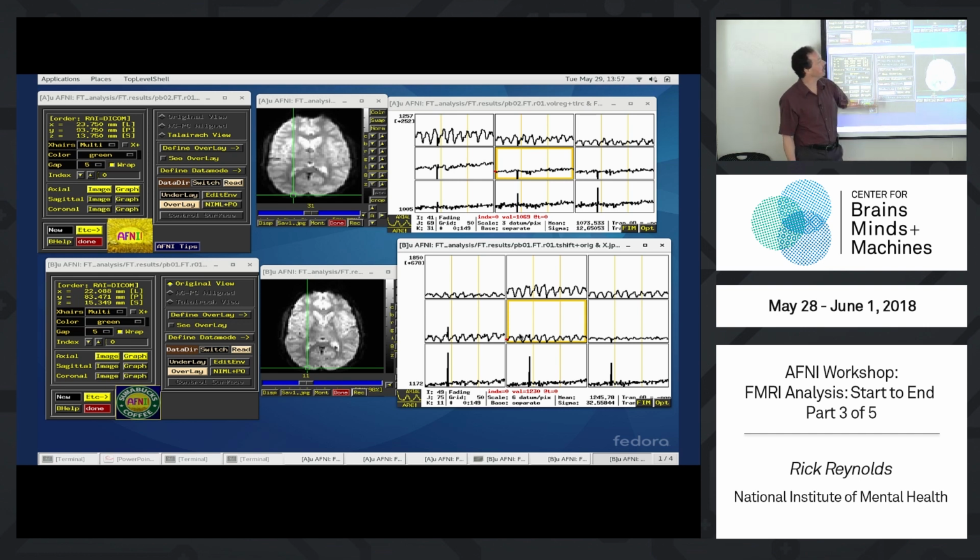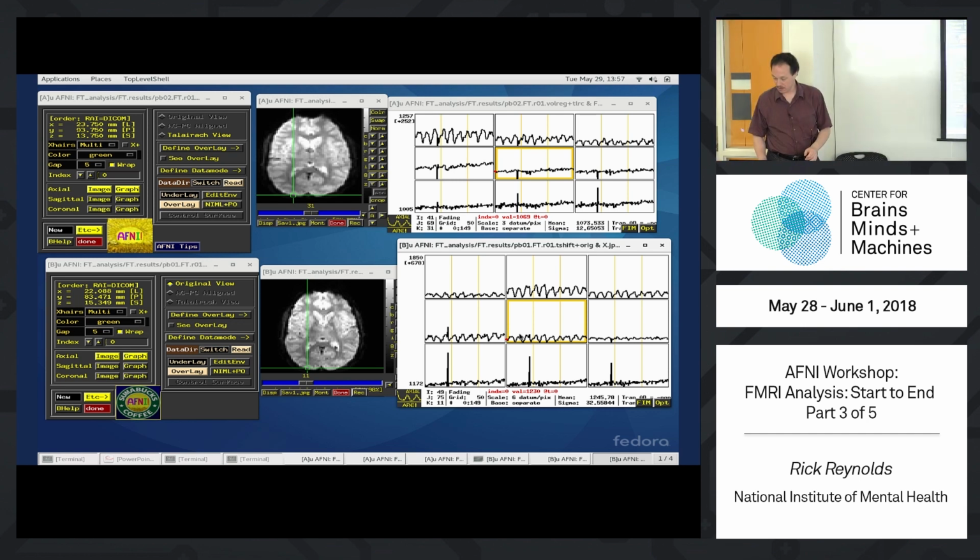So it's a little harder to keep this in line. Do we want to stay at this ugly time series voxel or move to a happier one? It's okay. We can shift later when we care more. Maybe when we talk about the linear regression.